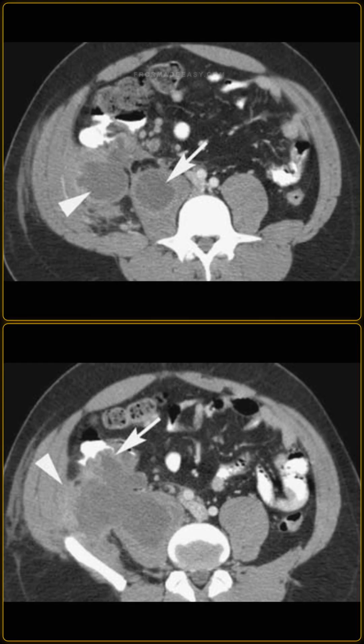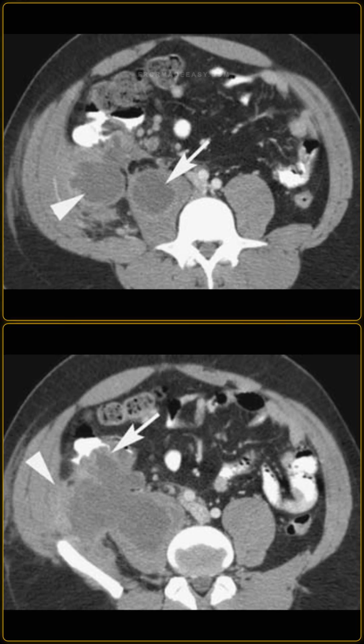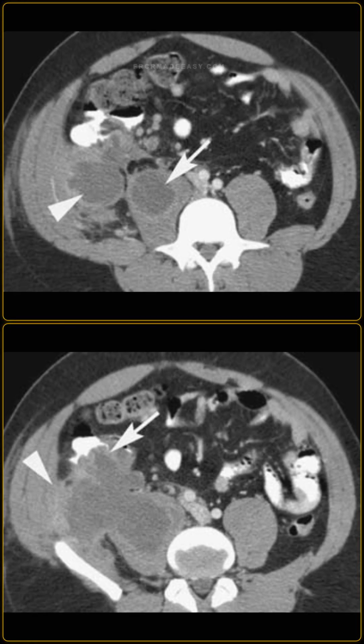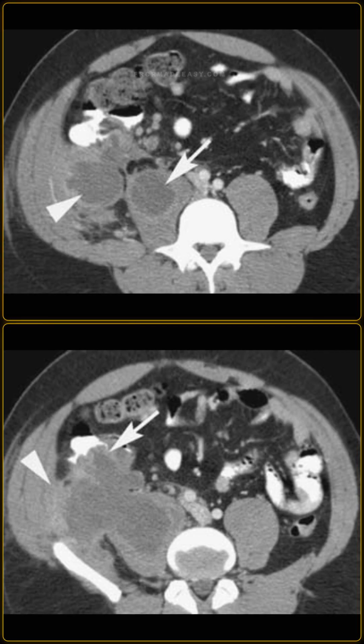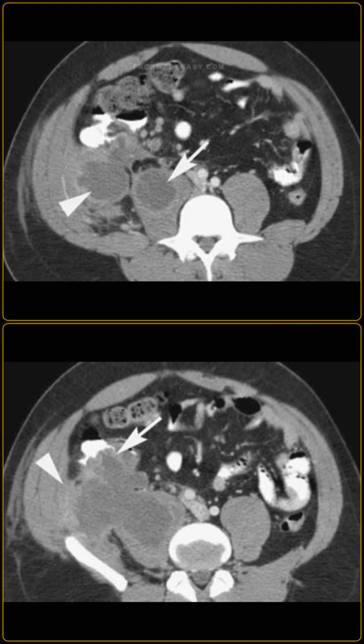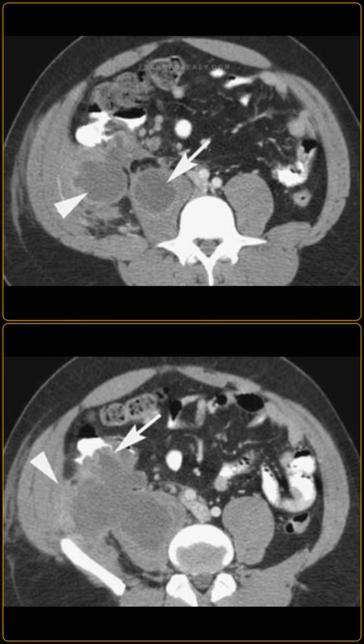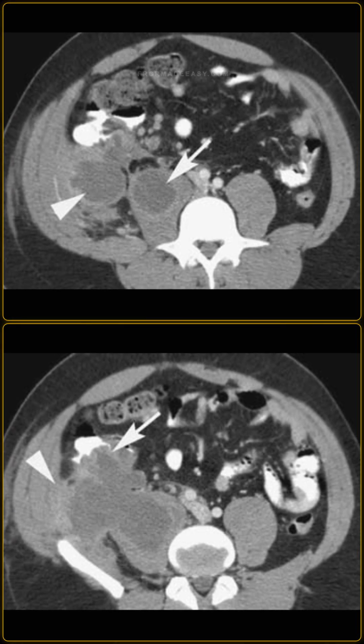I'd say, crucially, within the cecal lumen, there is a discrete, enhancing, solid polypoid soft tissue mass arising directly from the posterior wall, precisely at the origin of the retroperitoneal abscess. While severe acute appendicitis or Crohn's disease can certainly cause large right lower quadrant abscesses, what differentiates this case?